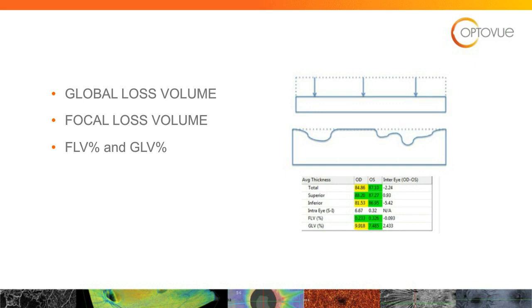The FLV percentage, I really want to highlight that, because there was a study in 2016 in the American Journal of Ophthalmology, and they found that the FLV percentage was the most significant predictive factor for visual field progression. And that's compared against pachymetry and a lot of these other parameters, and it was the one factor that stood heads and tails above the rest. So if you're not looking at the FLV percentage on a regular basis, I would encourage you to do so.